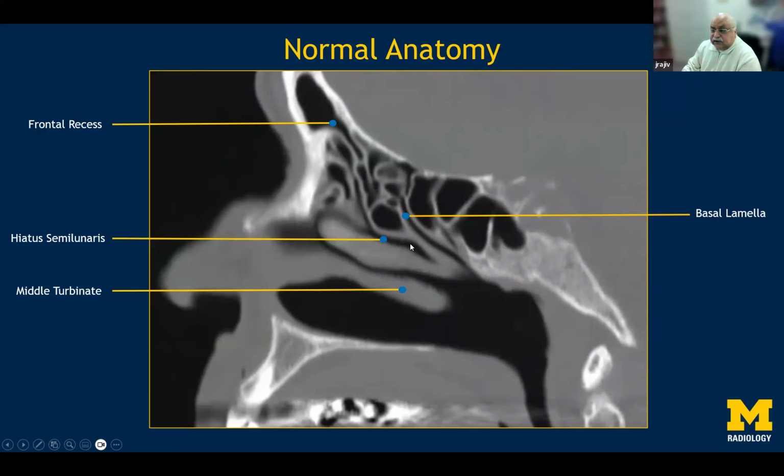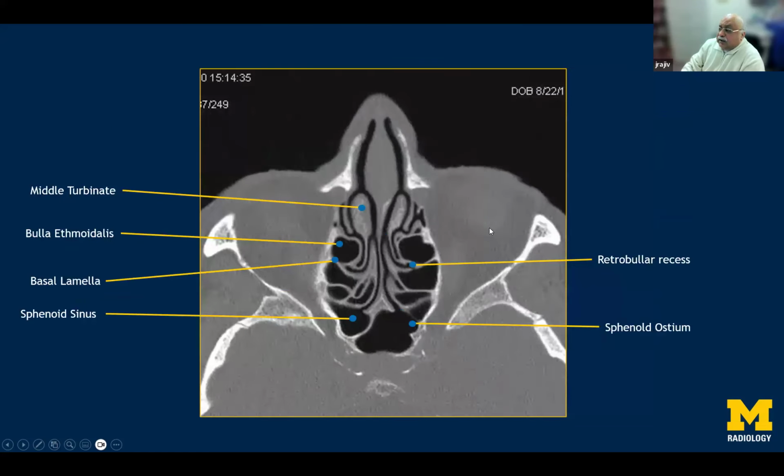So, a variation of the same theme again. And you can make out the posterior ethmoid air cells and portions of the sphenoid sinus here. In the axial sections, it shows a very nice pattern here, which is very important for me because I think that apart from fingerprints, the shape and size of the ethmoid sinus are so unique to a single person that it is next to impossible to duplicate that in any other human being.